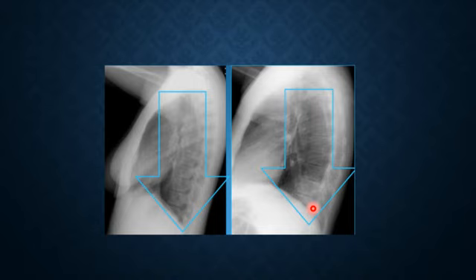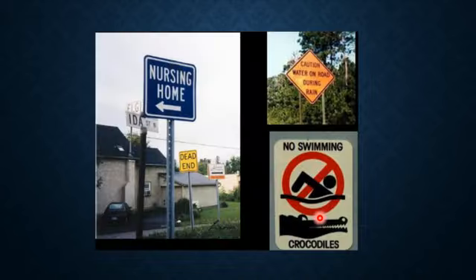So if this does not happen, it indicates there is something at the posterior lower part increasing the density of the spine. For example, here you can see when you go down, it's more black, and then there is increased density, indicating there is something here. The reason the spine in the lower part is more black is that the lung is thicker in the lower part. Exactly, there is more air in the way, so the X-ray penetrates more and gives you more detail. Okay. Well, this is a very interesting sign.